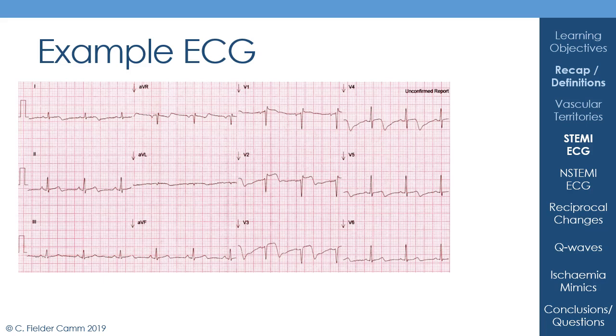Okay, so going through the ECG, what you'll see is I'll put up on the right-hand side the points that I'm talking about at each point. So we don't actually have any details. Hopefully all the ECGs that I've included here have been entirely anonymized.